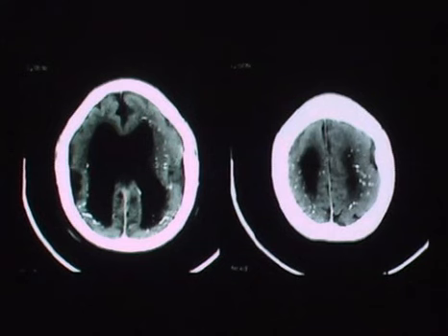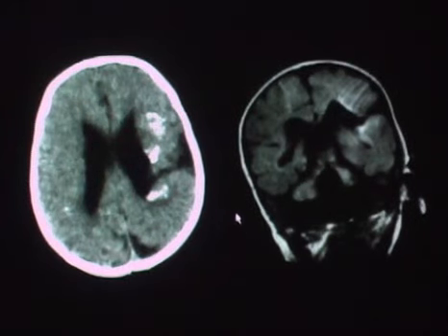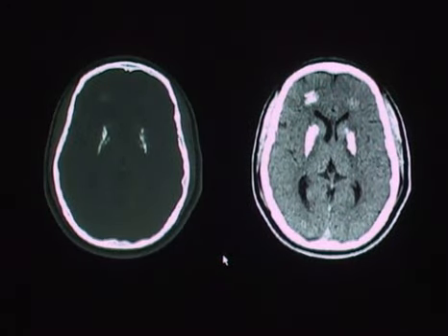So here's an example of CMV with diffuse scattered calcifications in the periventricular distribution. There's prominent volume loss with associated prominence of the ventricular system, but there are also abnormalities of cortical development with a relative lissencephaly associated with the infectious disease. Here's another case of a patient who had calcifications along the periventricular region on the left, but associated with this is a cleft compatible with schizencephaly, also another congenital developmental disorder associated with infectious disease on occasion. And here's another patient. Does this patient have something like a mineralizing angiopathy? Do they have a disorder of calcium metabolism? In this patient, it turned out to be a long-standing history of CMV infection.